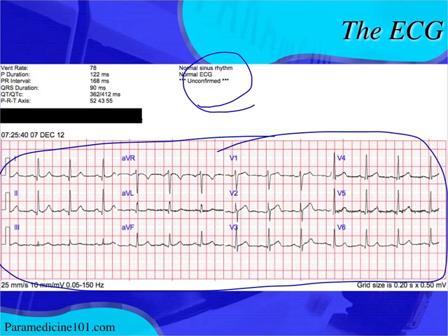Or perhaps the patient just has a critical lesion that hasn't yet totally occluded the coronary artery itself, and when you provide that dilation of the coronary arteries, you're now returning blood flow, eliminating all that ST elevation that we saw before. This is also a good reason you should get a 12-lead EKG prior to providing that first nitro spray or tablet.